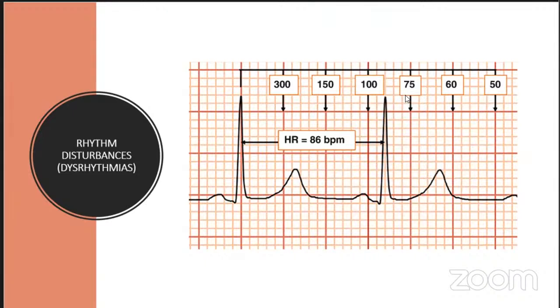So you can see if this is going to be 75 and this is 100, if we break it down, so let's say here will be 80, and this should be about 85, 86 mark. Again, like I said, it's an estimate.